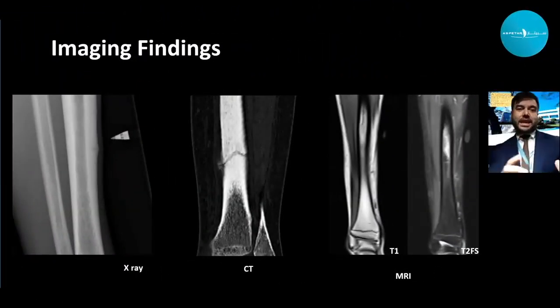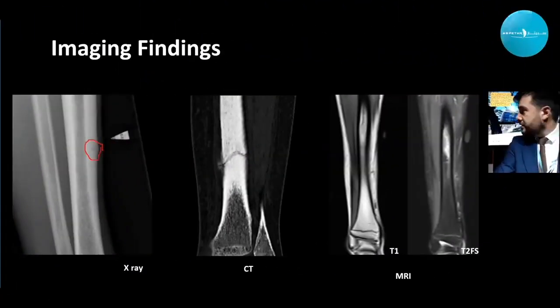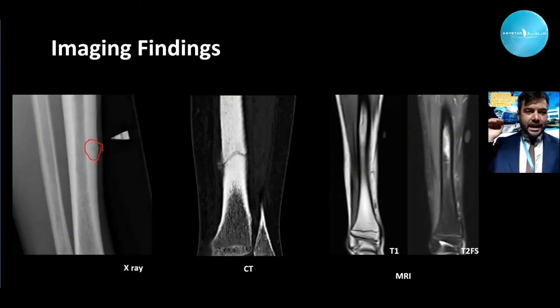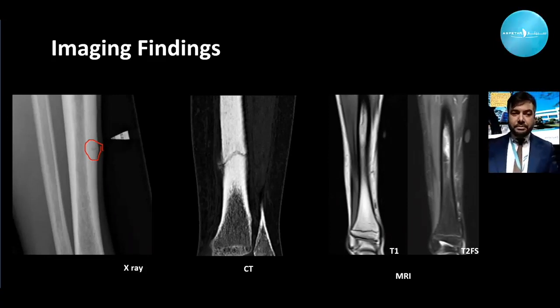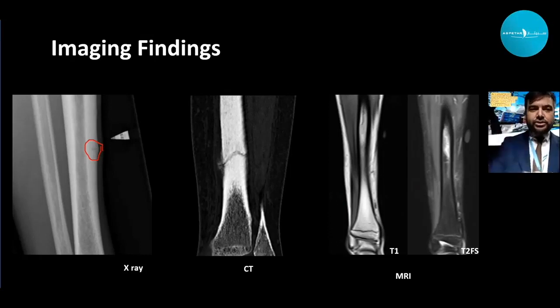How can we see fractures in imaging? Here we have some examples with the different techniques that we normally use. There is an incomplete fracture. It's a radiolucent line. The signs in X-rays correspond to the incomplete fracture. Normally, they are perpendicular to the direction of the load.